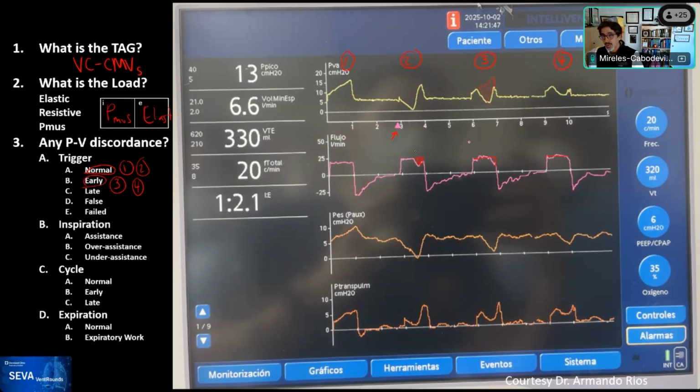And I can ask, how would you treat it? But before we get there, let's just for a second look at the amount of work shifting that occurs. If I draw again the waveform here for the other one, it would look like this. So that's all the amount of work that the patient is doing, and then this one looks somewhat like that. And so the benefit of this is that you can see how it goes below the baseline on breath number two and breath number three. And then on breath number four, it doesn't.